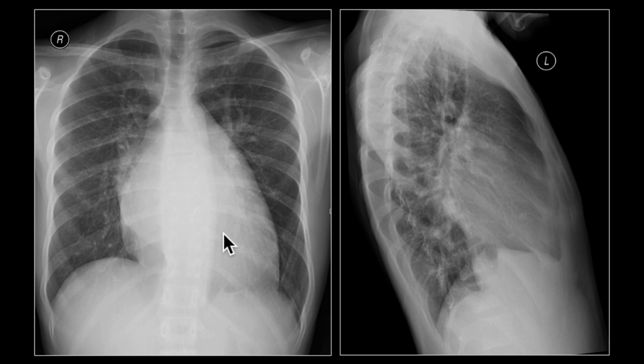So this is known as the first stage of pulmonary edema. In other terms, you could also call this radiographically cephalization, since the vessels are going cephalically. You could call it vascular redistribution. You could also call it upward diversion. So they're all the same names for the same process, which is pulmonary venous congestion, the earliest stage of pulmonary edema.